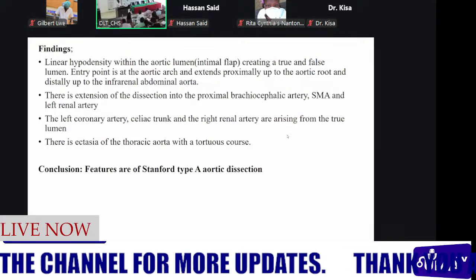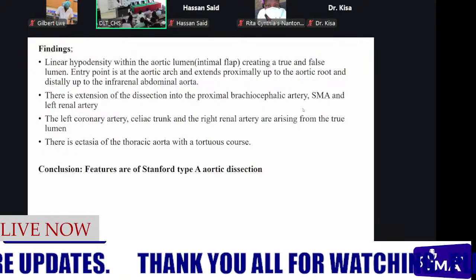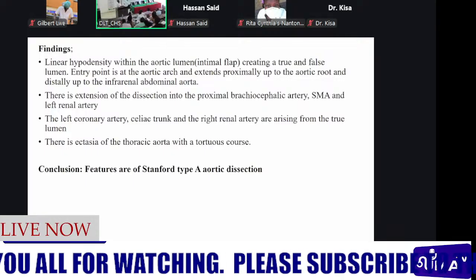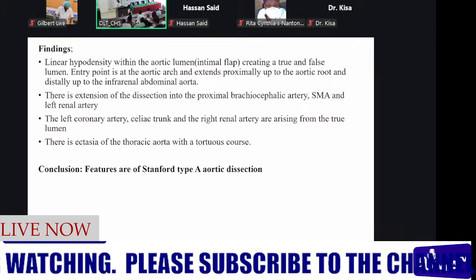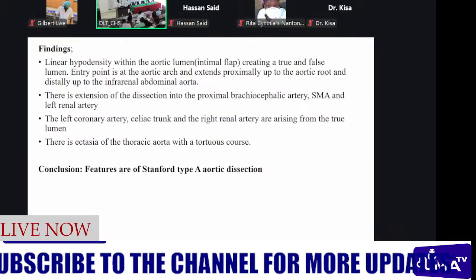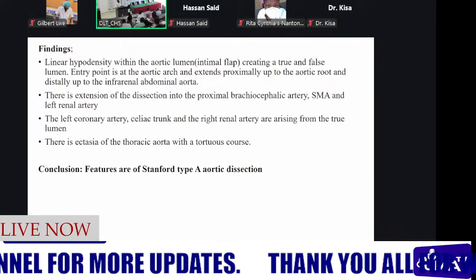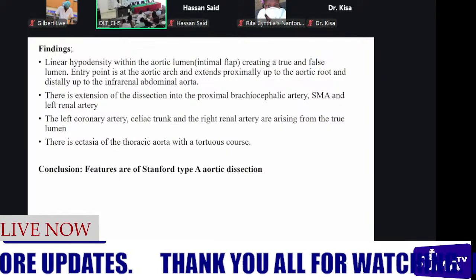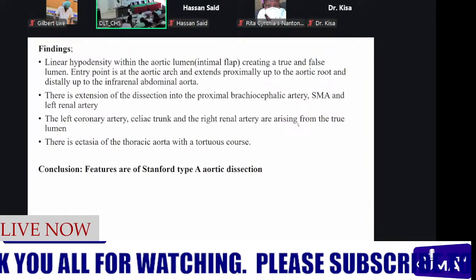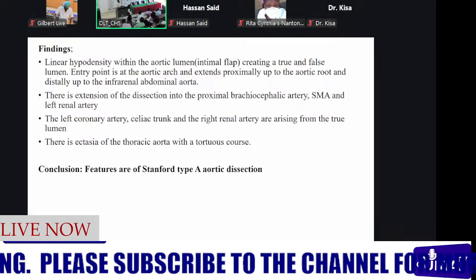So in summary, we had a linear hypodensity, which is the intimal flap, which was creating a true and false lumen. The entry point was at the aortic arch, extending proximally to the root and distally up to the infrarenal abdominal aorta. Then we had a dissection extending into the brachiocephalic trunk proximally, the proximal portion of the SMA, as well as the proximal portion of the left renal artery. However, our left coronary artery, the celiac trunk, and the right renal artery were arising from the true lumen. We couldn't visualize the right coronary artery in the images.